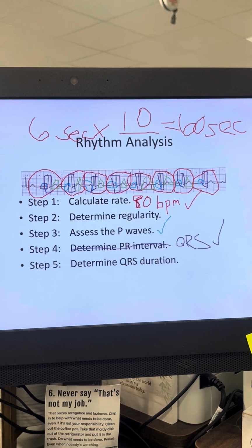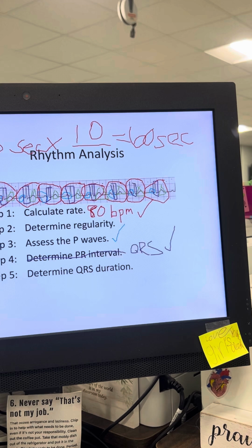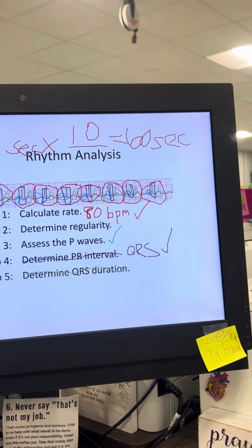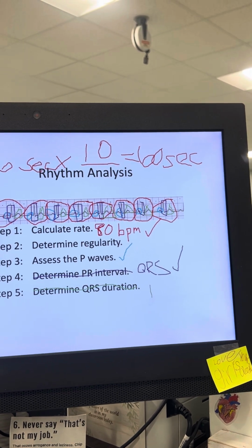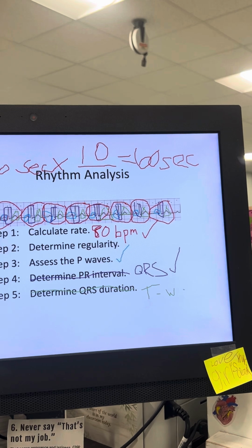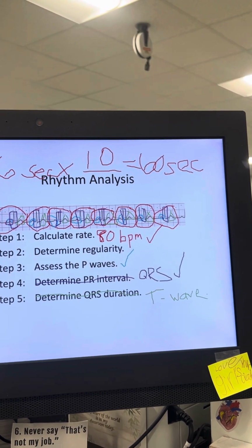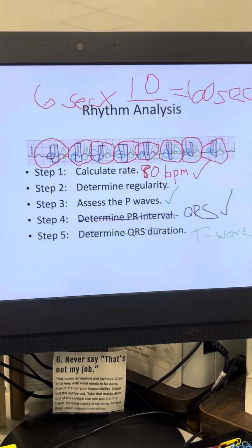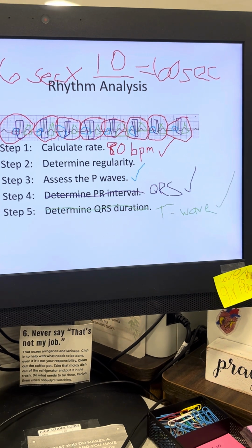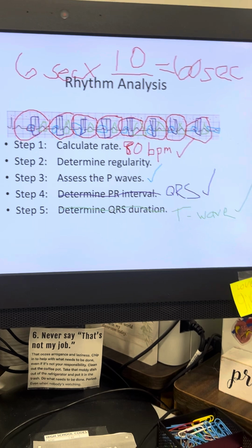It's got to follow after the QRS complex. We're going to look at the T wave, and we're going to say check, okay? So far, y'all, I've looked at everything, and I should have looked at this P wave right here. Whoops. Because it's on my rhythm strip, so I have to evaluate the entire thing.